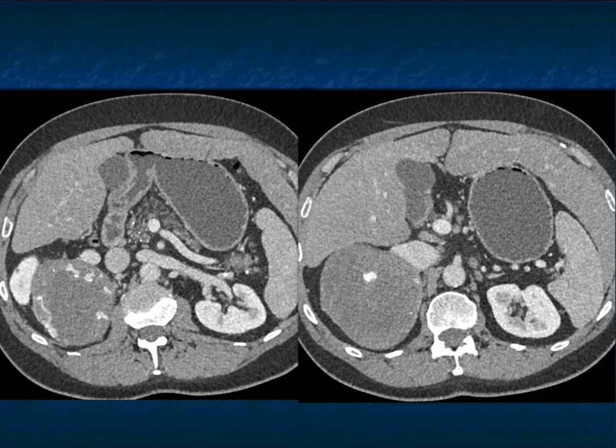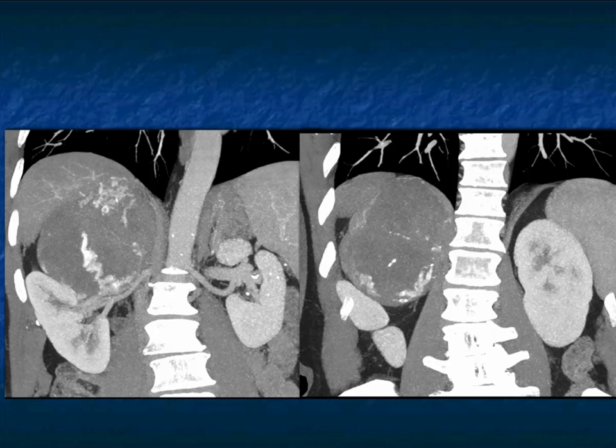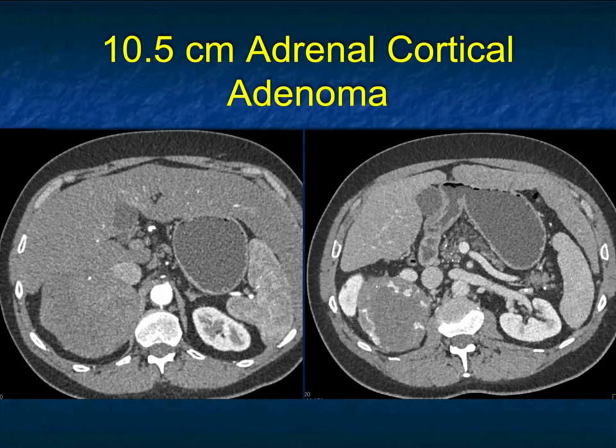It's a little atypical for what you would expect to see with a hepatoma metastasizing to the adrenal. You can see neovascularity, but not this puddling. It's not the look of a pheo, which is vascular, but not with this puddling. An adenoma, I can't imagine all of these prominent vessels going through it. Could it be a hemangioma, something like that? I don't know. It's a large mass. What I do know is this lesion is going to come out, and it ended up being an adenoma. It had some bleeding within it, but it was just an adrenal cortical adenoma.